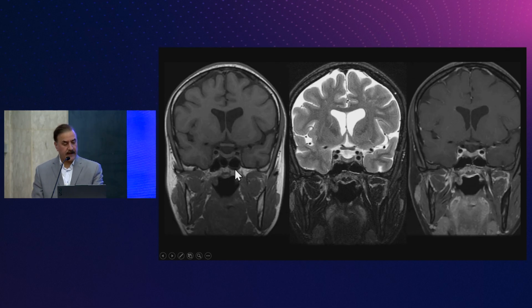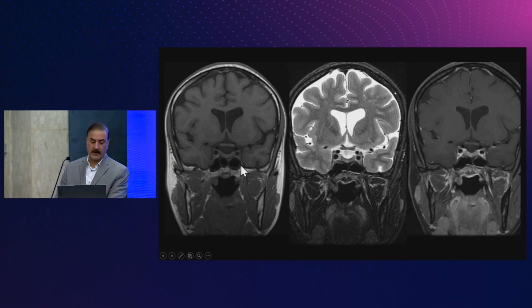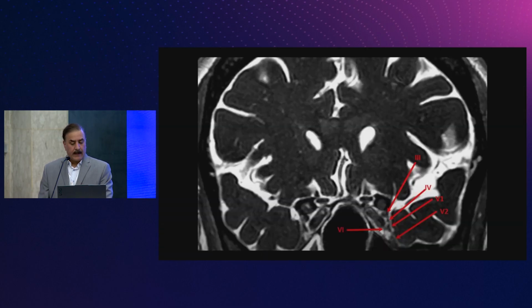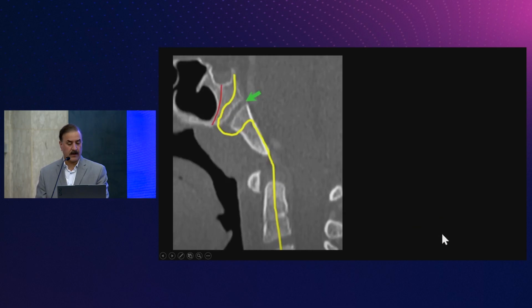The second other important thing that you have in the central skull base is your sella turcica, having the pituitary gland inside of it. And then as you extend out, you get into the Meckel's cave, and then you extend out and you get again into the foramen ovale. Cavernous sinus is part of the central skull base, so pathologies that will involve the cavernous sinus are pathologies of the central skull base. We already talked how the nerves are in there, arranged on the lateral wall, and 6, which is right next to the carotid artery.